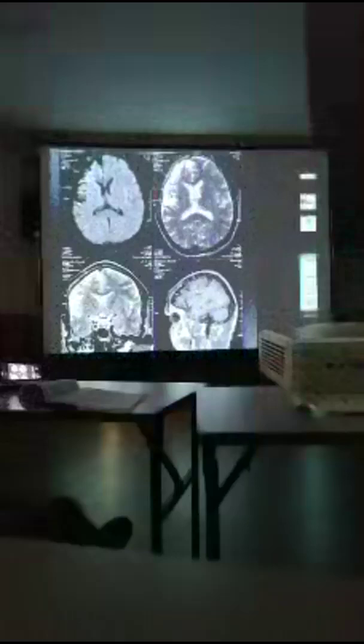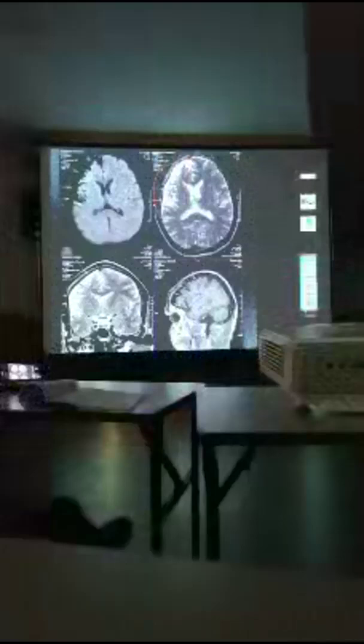This is very classical of subacute sclerosing panencephalitis. Rasmussen's encephalitis is a chronic form manifesting as seizures, progressive hemiplegia, psychomotor dissociation. You can see the unihemispheric atrophy. It is classical. Whenever you are having one hemispheric atrophy, is it Sturge-Weber? Is it Dyke-Davidoff-Masson? Is it Rasmussen's encephalitis? The clinical question will be answered in the clinical examination. If the patient is having continuous epilepsia partialis, it is a very classical manifestation of Rasmussen.